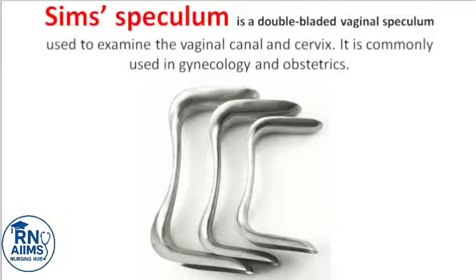Sims speculum is a double-bladed vaginal speculum used to examine the vaginal canal and cervix. It is commonly used in gynecology and obstetrics.